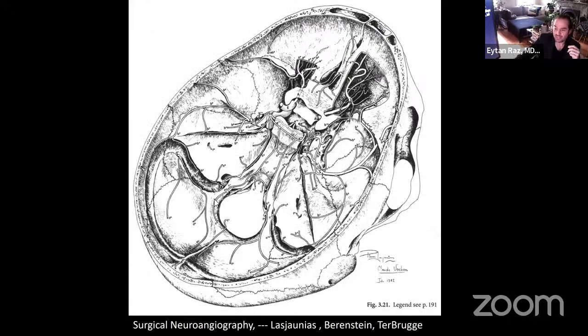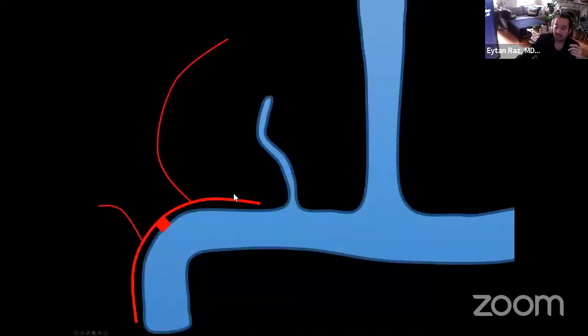The presence of this arterial arcade is something that we know from Lasjaunias, Claude Vachon, in this incredible drawing that is still so real in every case we do. And you see these arterial arcades along the sinus. Essentially these are the ones that become hypertrophied with AV fistula, but then they find the hole with the sinus in some way like this.